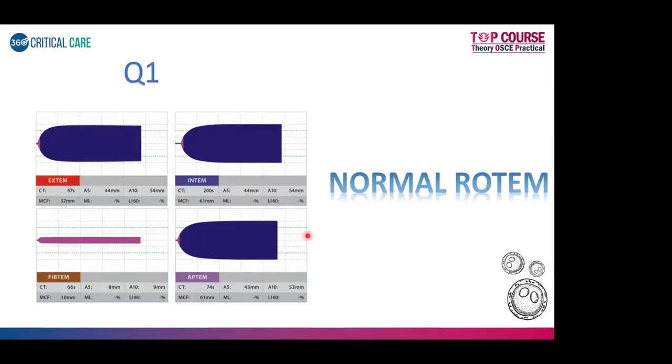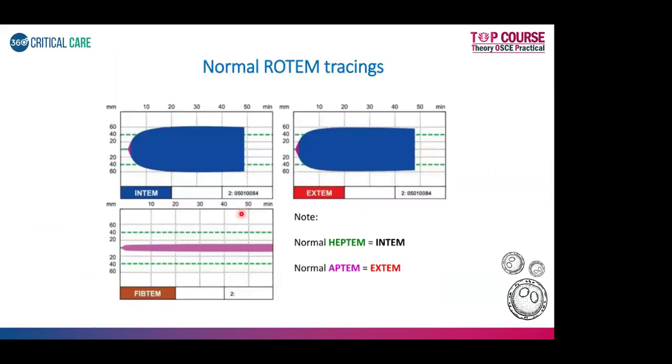Sir, can you repeat how the ROTEM can indicate hypercoagulability? So for hypercoagulability, you have to see if the CT is shortened, and the amplitude is larger, and then FIBTEM, fibrinogen values and platelets will also be higher. So usually you will see a slightly widened graph. Earlier I showed you for 1 minute. Okay.